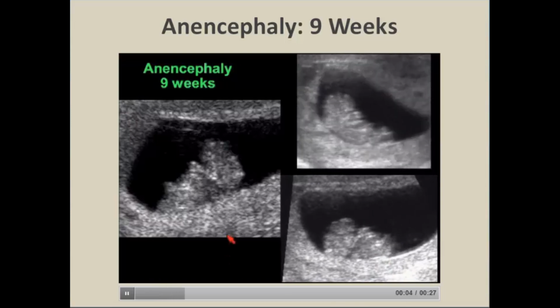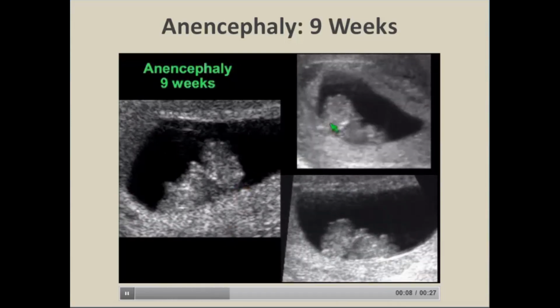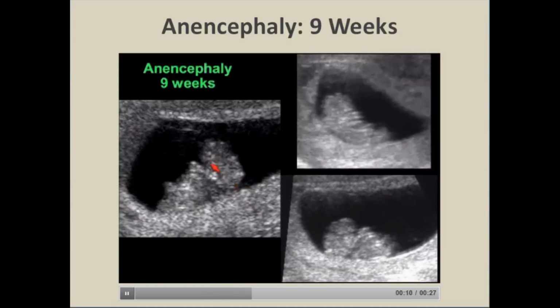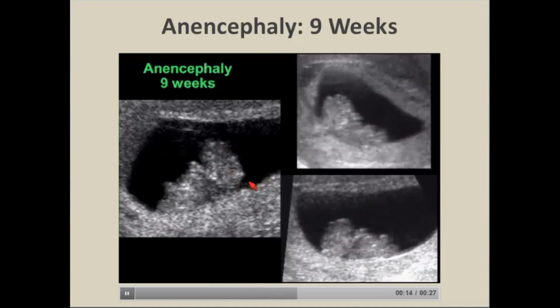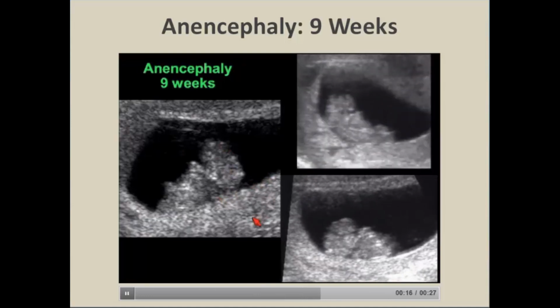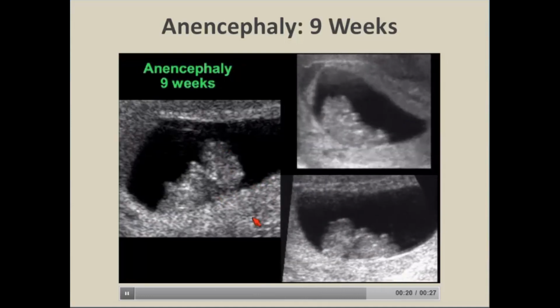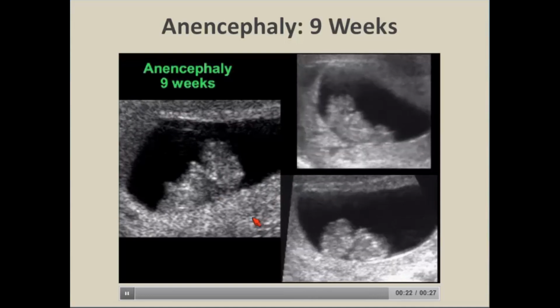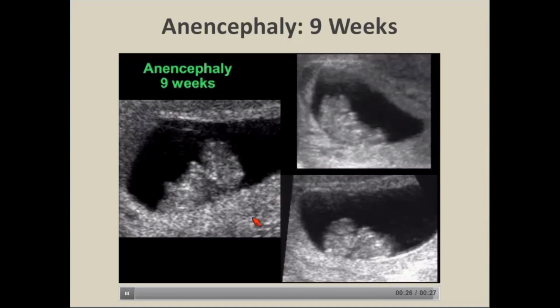You can see it looks a lot different than the 9-week fetus I showed you that had those nice extremities. Instead of a nice rounded cranium at the top, we see a very irregularly shaped cranium. This is the dystrophic brain tissue that develops and protrudes out from where the skull should be in fetuses who have anencephaly. This fetus came back at 18 weeks gestation.